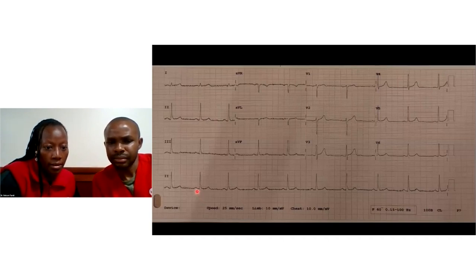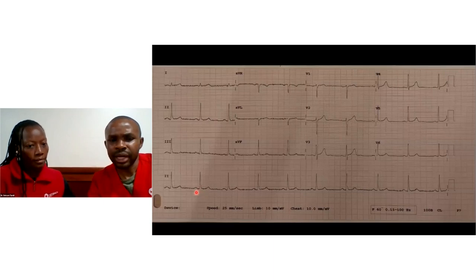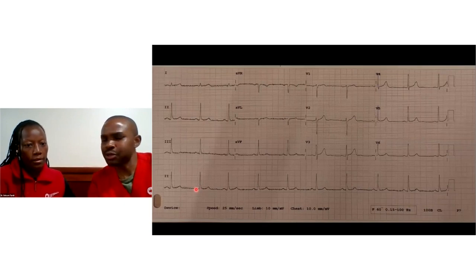This is it. This distance at the end of this deflection, then to the beginning of the Q wave over here. Okay. This rather flat line over here, that would be the PR segment. All right, so the current has started from the sinoatrial node, it has flown through the atria, it has caused the contraction, and it has given us a P wave. Now it's going to flow through the AV node, right? And we are saying there's a delay there. And that's what gives us this PR, what you're calling the segment.